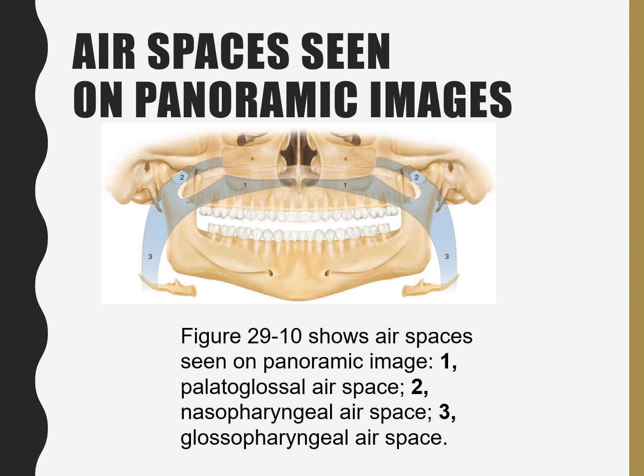Here's this image again, and you can see this image in your book and refer back to it on page 358. It's figure 29-10. You can see the palatoglossal, the nasopharyngeal, and the glossopharyngeal air spaces.